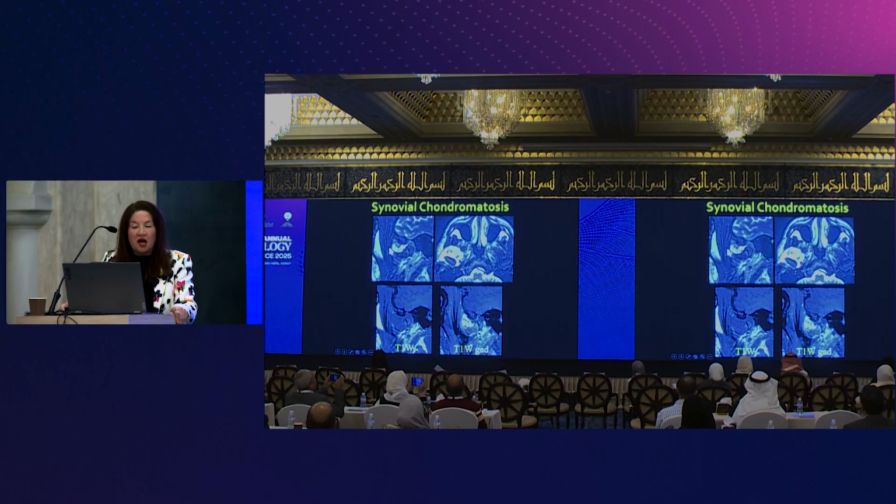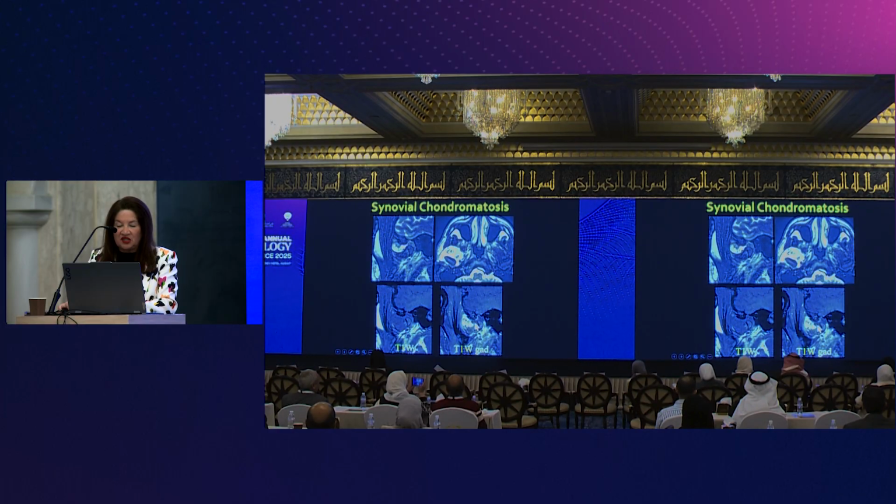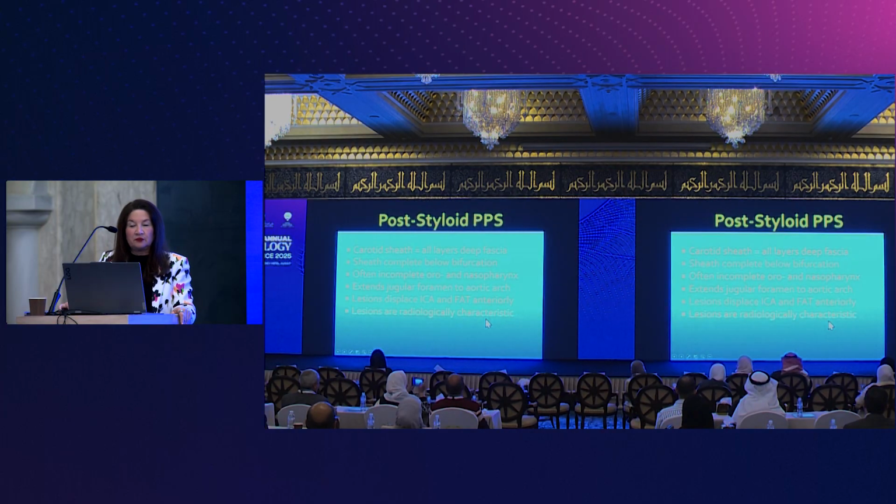You'll see a big locular mass sitting in the temporomandibular joint underneath the articular eminence, and look at the profound mass effect sitting on the lateral pterygoid muscle that inserts up on the temporomandibular joint. Here you'll see the axial T2 weighted image. This is all the mass and the synovium going into the masticator space. And following contrast, you can see the enhancing inflammatory synovium, and all the filling defects are the chondroid material.